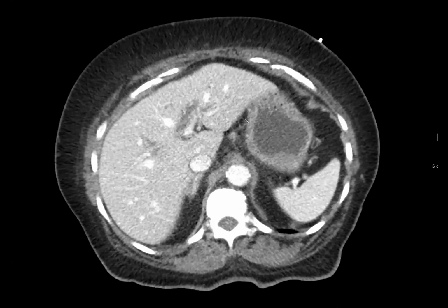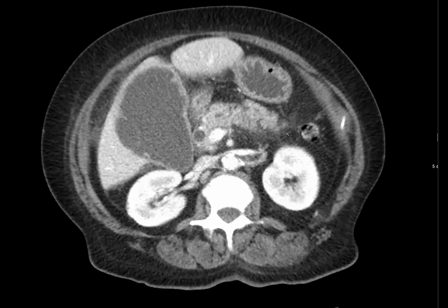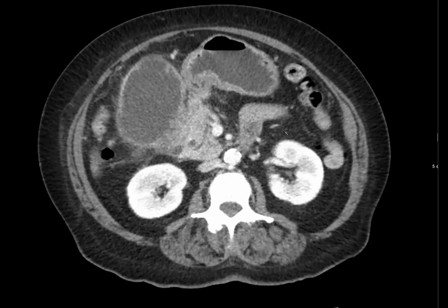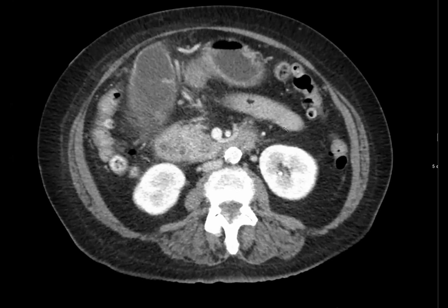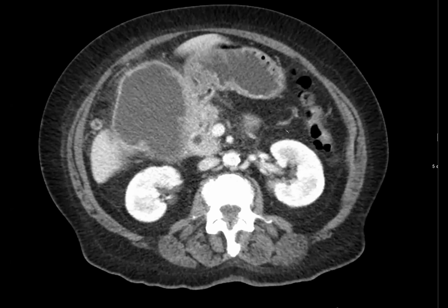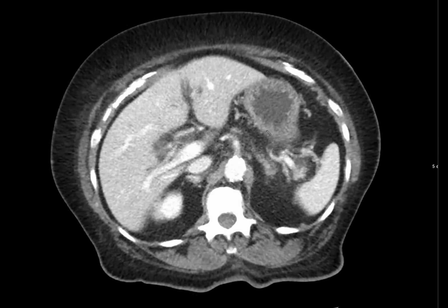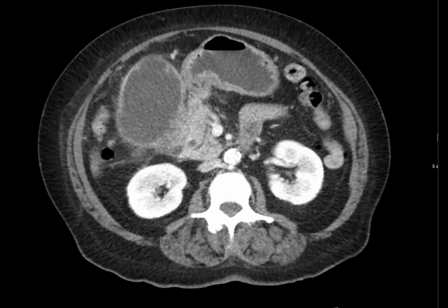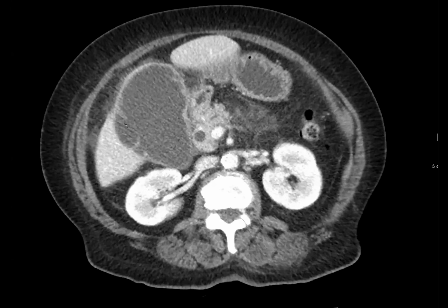And then just one more quick case. This patient had right upper quadrant pain. What do you guys think about the gallbladder? Looks like complicated cholecystitis. And what do you mean complicated? Like probably contained perforation. Yeah, so that's exactly what we were concerned about.